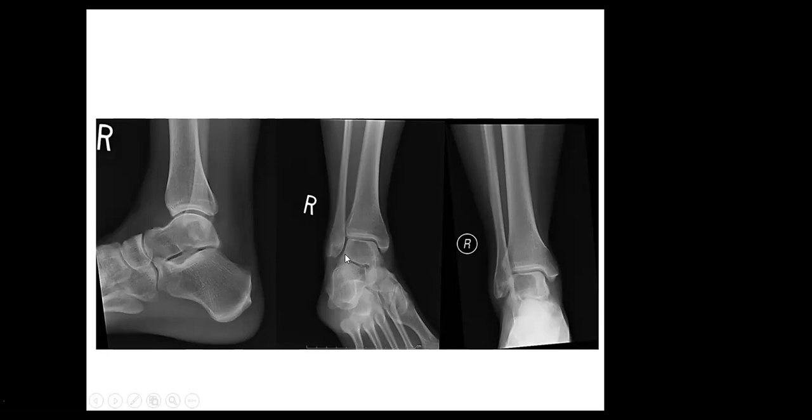A degenerative cyst can also be subarticular, but there is no degeneration, so we cannot say ganglion cyst when the joint is so clean. If we had osteoarthritis of the joint, then we would be talking about maybe a geode or degenerative cyst or a ganglion cyst. But this is a young adult with otherwise normal joint space. They just have a lytic lesion in the subarticular space.